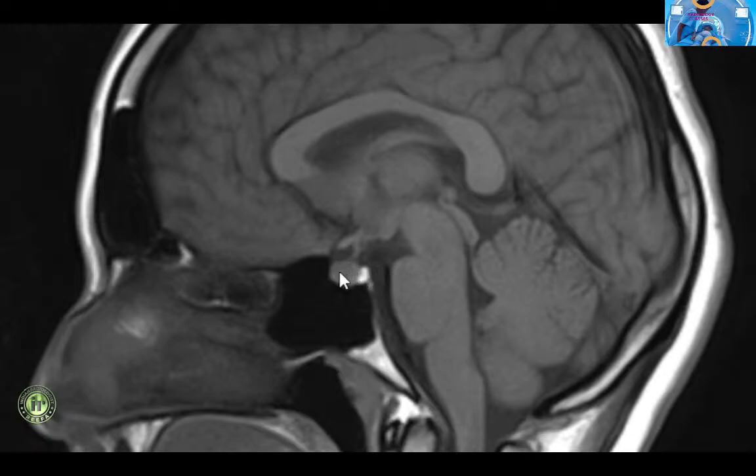The pituitary gland fills up the pituitary fossa and is situated above the sphenoid sinus with cavernous sinus on each side. The height of the pituitary gland varies with age, but it should not exceed more than 9 mm. In females of childbearing age, the pituitary gland has a convex superior margin. The anterior and posterior lobes of the pituitary gland can be identified separately.